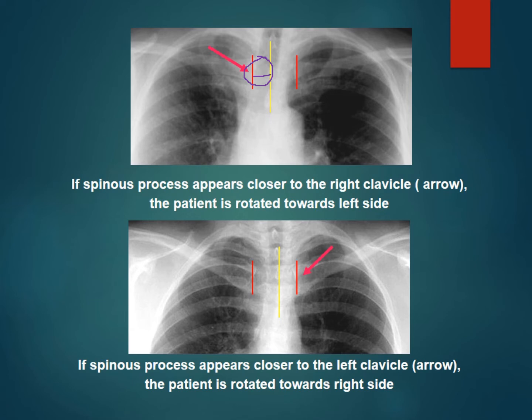And if we look at the figure which is below here, the distance is less on the left side, so the patient is rotated towards the right side.